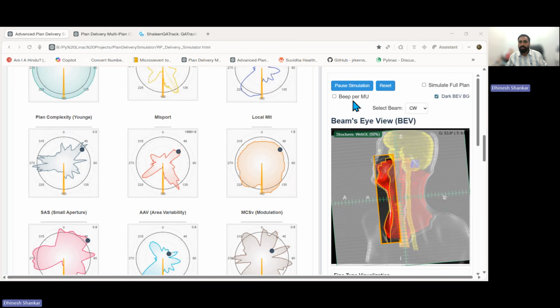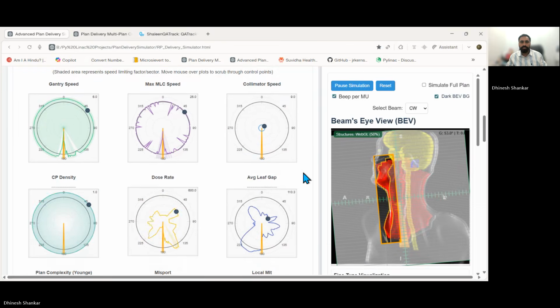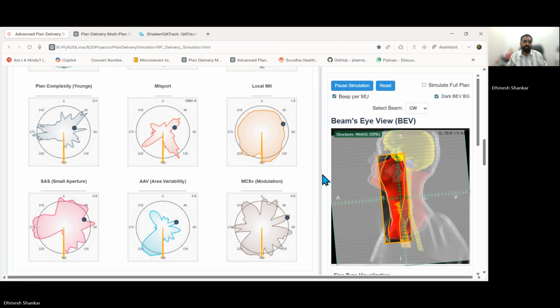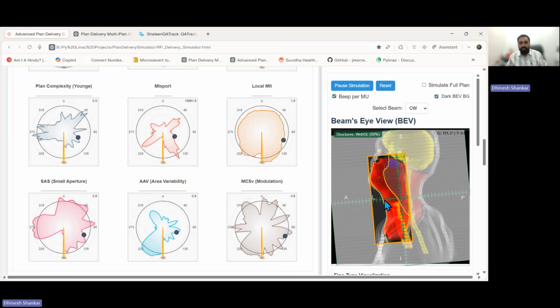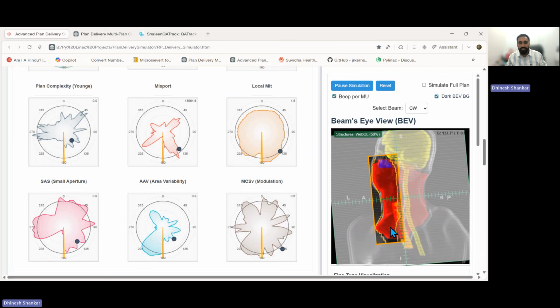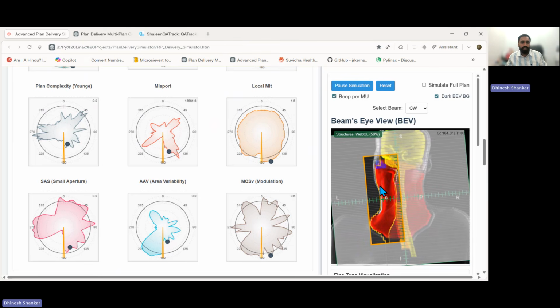And we can run the file. You can see the black dot moving according to the plan, and this particular plan was planned with a very high aperture shape controller setting. So it looks uniform.